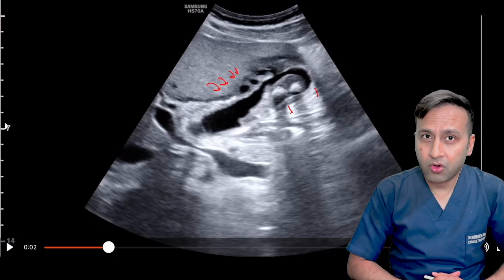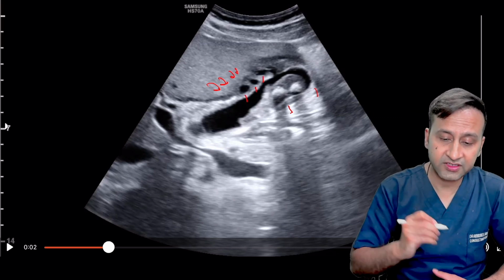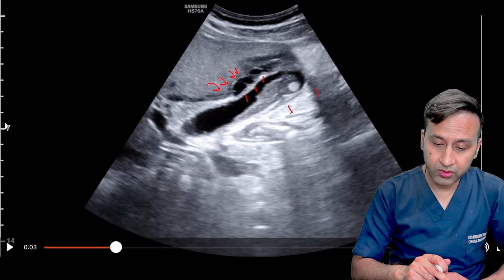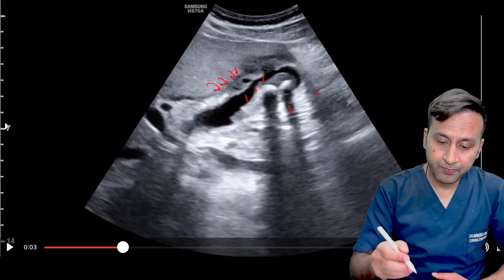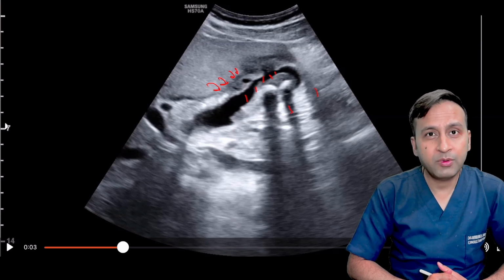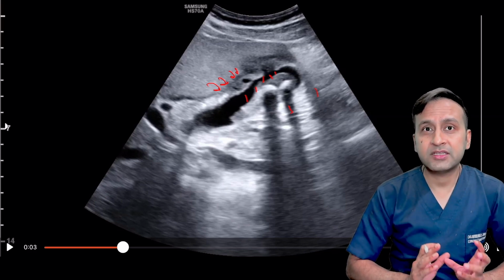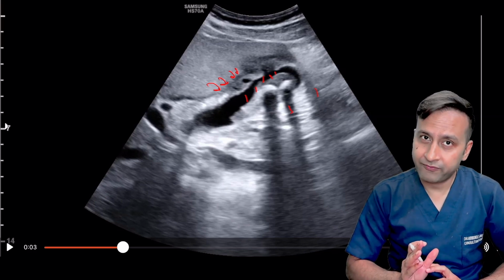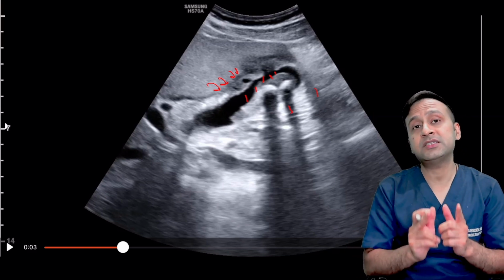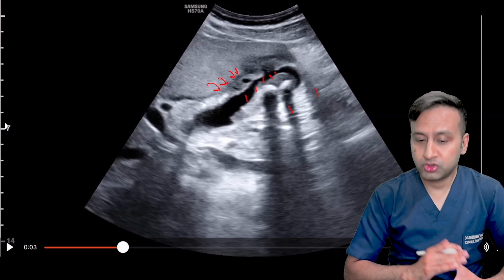Secondly, if you look at the gallbladder wall, it is not just thickened. We can see some cystic areas. All these are cystic areas which are located within the thickened gallbladder wall. And when I just scroll it towards the other side, I can see that here exactly one of those cystic areas is showing a loss of the normal mucosal outline, and it is communicating with the lumen of the gallbladder. So this is the basic pathology. Gallstone disease, obviously, presence of gallbladder sludge, thickening of wall, plus presence of cystic spaces within the thickened wall of the gallbladder.